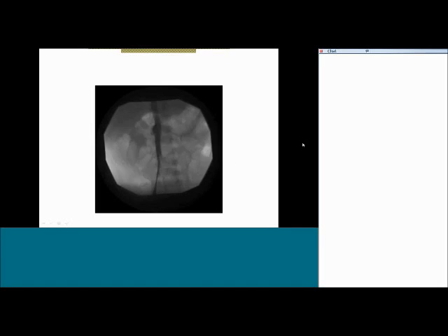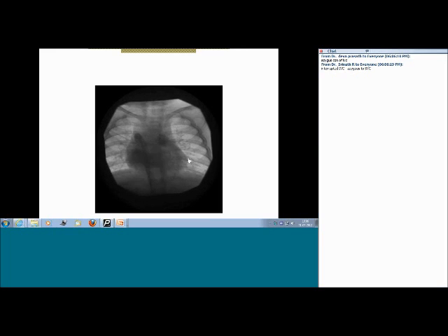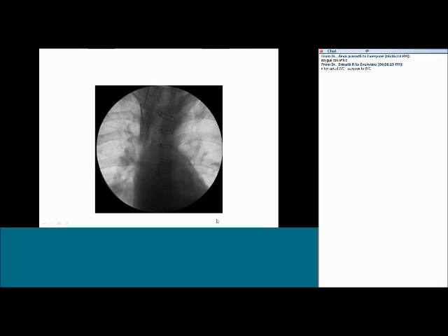Okay, what is this now? Yeah, okay. Go on, start down. Okay, azygous continues. So what is it? Interrupted IVC. Yeah, that's the right answer. Okay. Next.